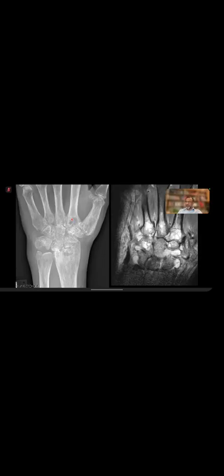Okay, so this is, as mentioned, my initial case I showed you. This was a clue here. Of course, there are many erosions there, another erosion in the distal radius, and erosion of the triquetral bone, marked osteopenia. It can be septic arthritis, it can be inflammatory, but this is a clue. Big erosion of the metacarpal.